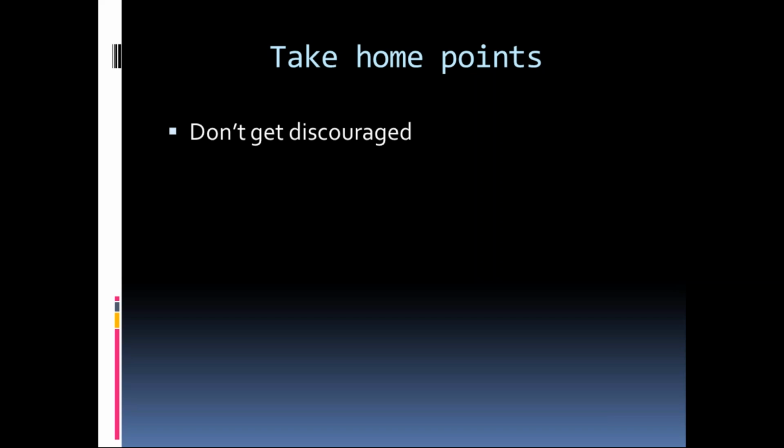The first is don't panic, okay? Like I said before, I have plenty of my own oh my god moments on what in the world am I going to do with this. I want to throw it back on the list and hope that nobody saw that I'd actually clicked on it. But the only way you're going to learn the high-res chest is to actually suffer through it. So don't get discouraged. Take a look at some of the lesser involved areas of the lung and see if you can ferret out some of the patterns.